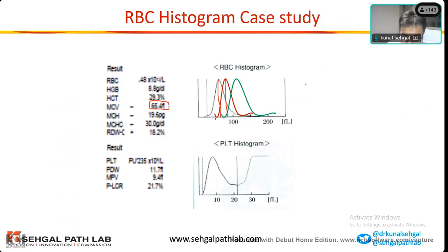Now, Dr. Akash, can you tell me, if I say the green color plot compared to the red or to this gray of this patient, will this be right shifted, normal, or left shifted? Sir, it is right shifted.